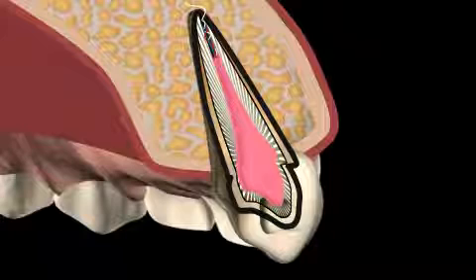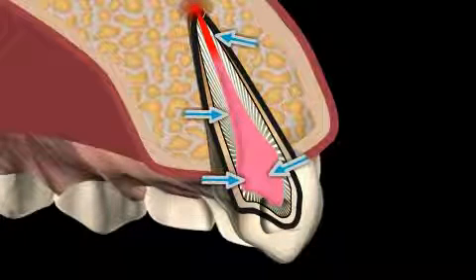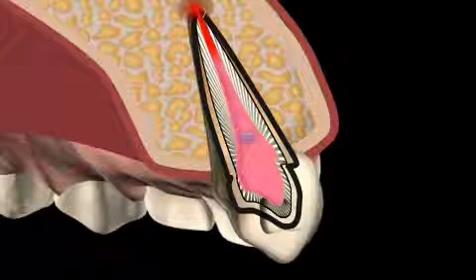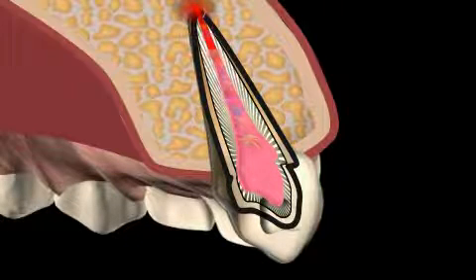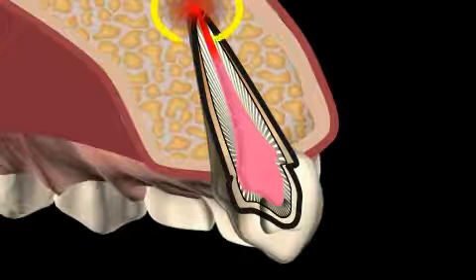If the root canal, as seen here in the video, is not cleaned thoroughly and filled properly, remaining canal bacteria may lead to chronic bone infection. If you'd like to know more about root treatment, check out the video by the same name.